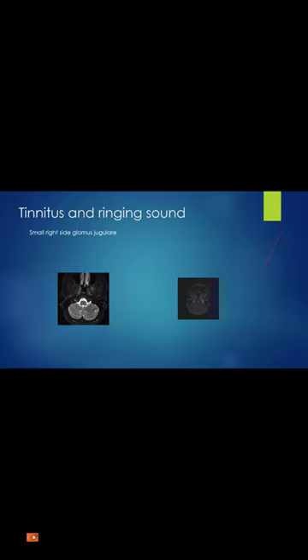Patient has tinnitus here, and there is glomus jugulare. Just make sure you don't miss this because this is an easy to miss finding. There is glomus tumor here.